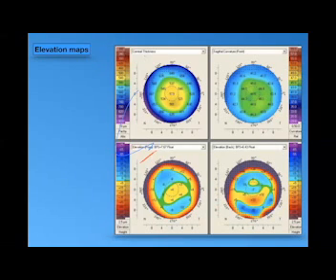And there is what's called a tongue-like protrusion in the back of the cornea. So these two signs, the tongue protrusion and the very high posterior elevation in this point, are highly suspicious, and you will correlate it with the sagittal curvature here. You will find here in the sagittal curvature for the same eye is 44.8, which is not steep. Then the coinciding point in the superior part is 45.